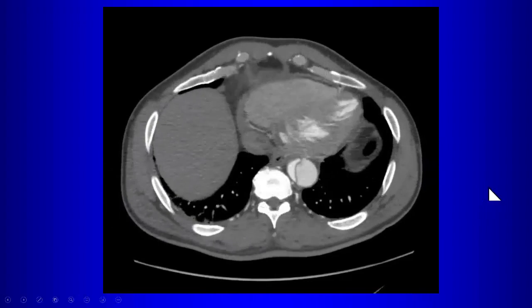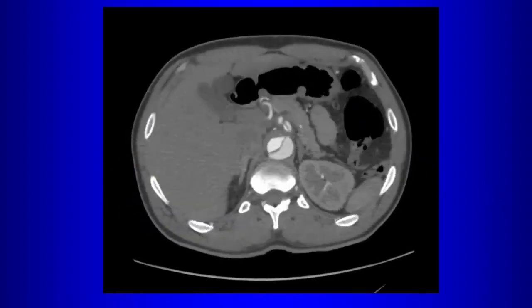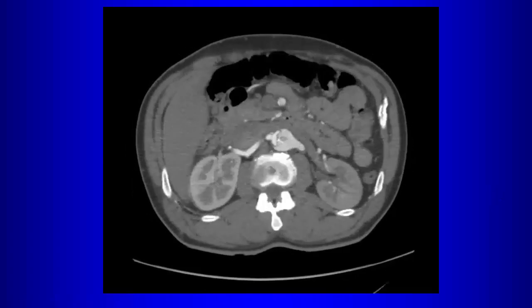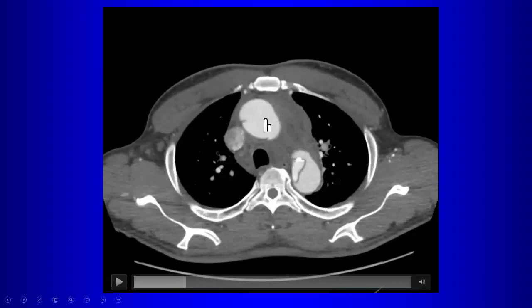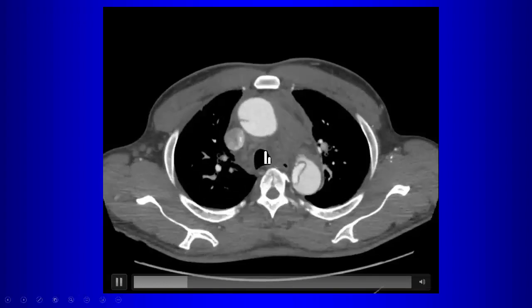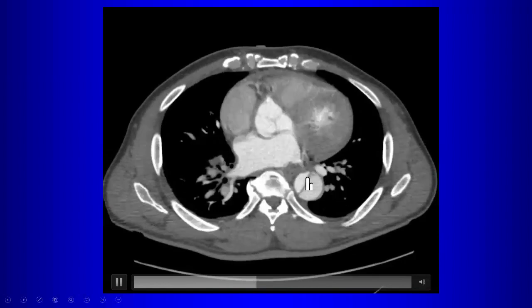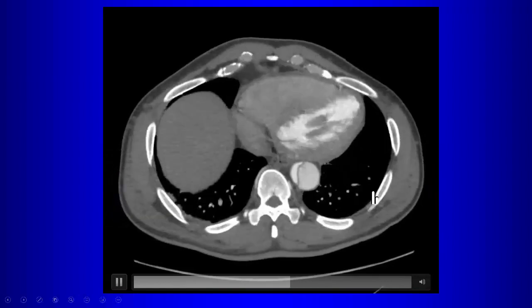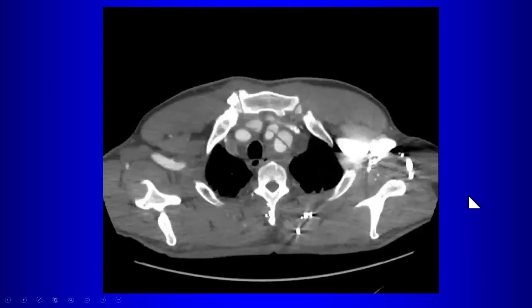Yeah, so here, the entry tear is in the ascending aorta, so then this we would classify as a type A, right? So this would be a type A dissection, right? You can see it does extend to the branch vessel. You can see the discontinuity there in the dissection flap in the ascending aorta. So the entry tear then is in the ascending aorta. Here's the false lumen, usually larger than the true lumen, and you can see compression there of the true lumen by the false lumen. So this would be a true type A dissection, okay?